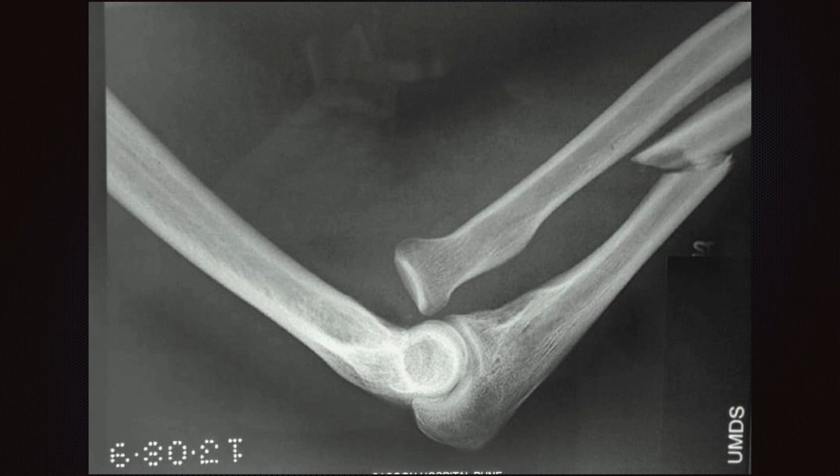However, I can see a fracture of the proximal shaft of the ulna along with a dislocation of the head of the radius. The ulnar fracture is a simple fracture with a direction which is approximately a short oblique kind of an orientation. The fracture is displaced with a volar angulation and the head of the radius is dislocated anteriorly. Therefore, my diagnosis is a Monteggia type 1 fracture dislocation. The name of the classification is Bado classification.